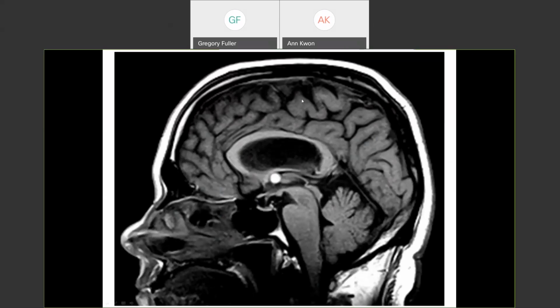How do you know it's almost exactly mid-sagittal? Because you can see the surface of the gyri here. We're not seeing cuts into the white matter anywhere, which means there's probably not a supratentorial mass of any significance on either side, because it would be pushing that part of the brain over.